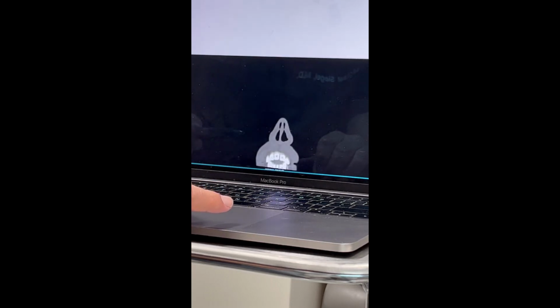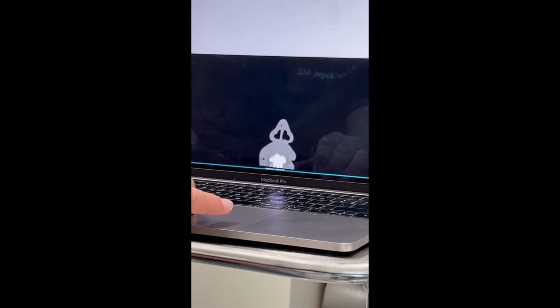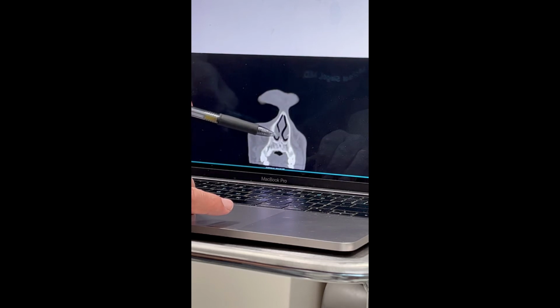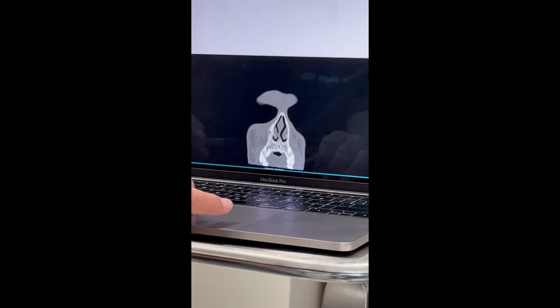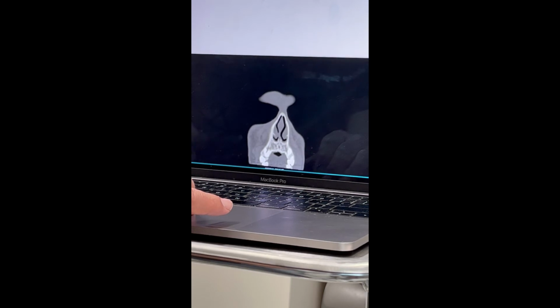So let's start off in the front of the septum, and you see in the very front of the nose, the septum is pretty straight, and these are your lips. And as we move back, you can see the septum start to bend over to this right side. So two things: you see the septum bending over, and let's just focus on the septum. And you see it bend over, now it's contacting the lower turbinate. The turbinates, again, are the things that warm and humidify the air in your nose. This bulge here is the swell body. So you can see in this patient, the swell body is enlarged and it's touching the lower turbinate. And the two of them, when they're touching, block your nose.